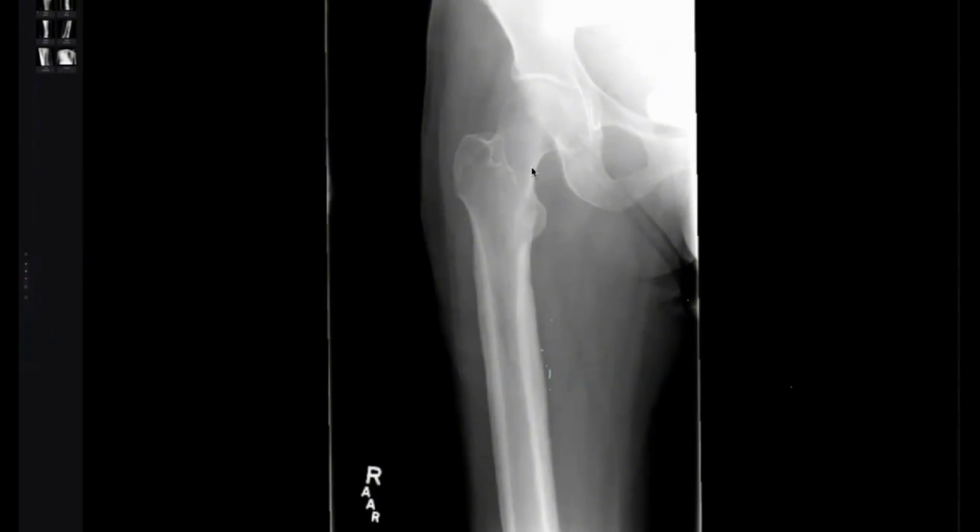I told you before, when you see an X-ray which looks like no obvious abnormality, you must look for two things, or you must exclude or prove two things. Tell me one of them. Sir, at the periphery of the image, in this case, I can see that there is a symmetrical periosteal reaction on both sides and cortical thickening. Excellent.